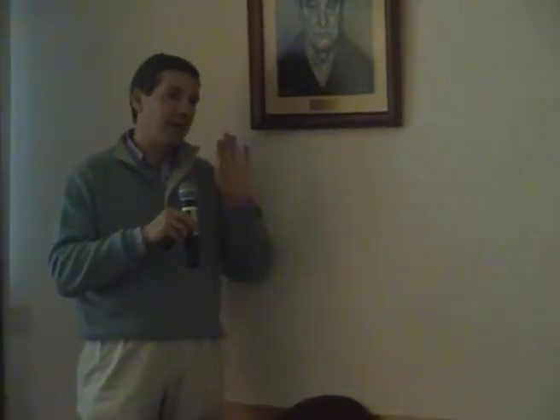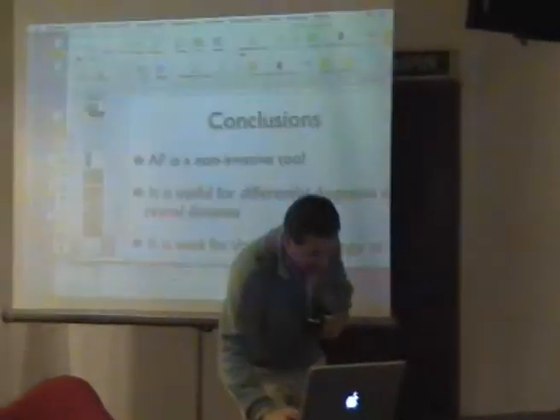And I just want to show you some quite interesting examples, in looking at color, and what we think about looking just at color, and what actually is the reality.